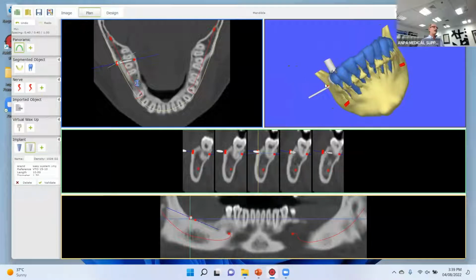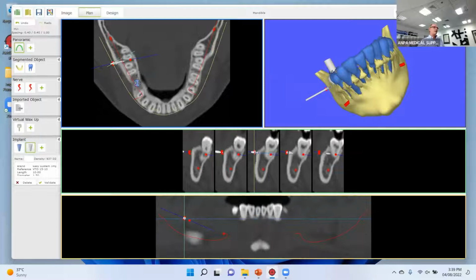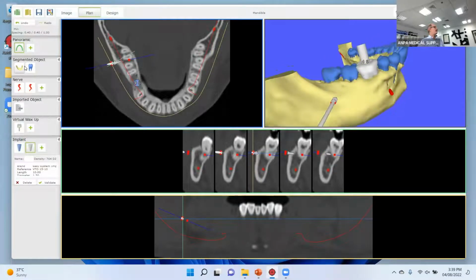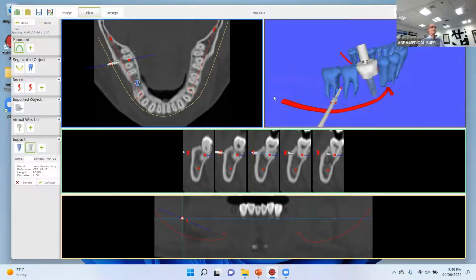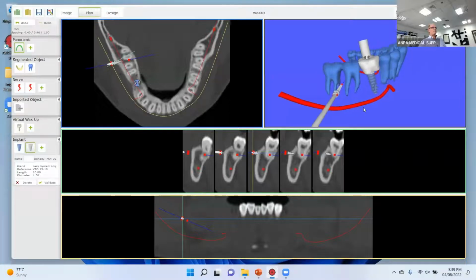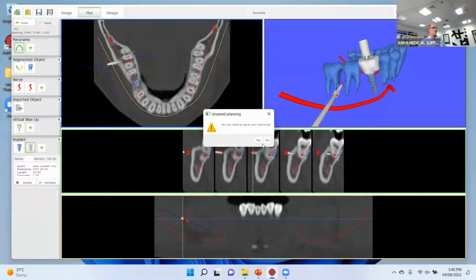And like this, I can put it a little more outside, okay? And in the soft tissue, it will emerge like this. And if I remove the bone to show you again, I see that my implant will not interfere with the adjacent root. And this is exactly what I want, and I can control that. And the orthodontist I'm working with is very happy with that, because he will save a lot of time to impact these teeth. Okay, so I think I have been covering the initial things that we can see with that.